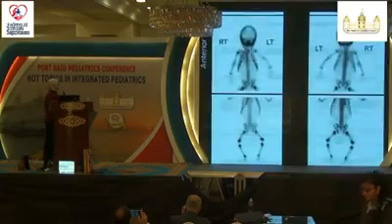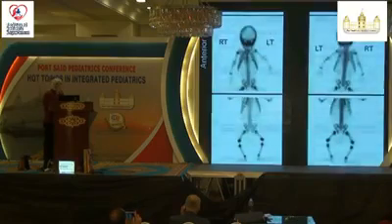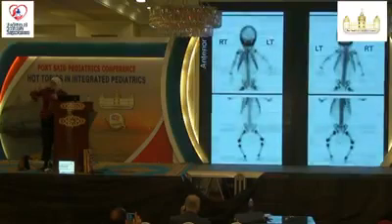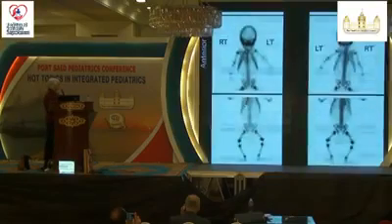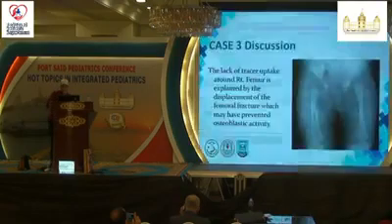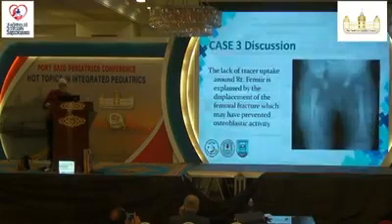Yes. Okay. Here are the hotspots, posterior right ribs, indicative of other fractures, which was also what we call the compression fracture. When a child is abused, the abuser grabs the baby, squeezes and presses hard on the ribs. Now look at the right femur. Where is the spiral fracture that we already saw in the X-ray? Why can we not see uptake? The lack of tracer uptake around the right femur is explained by the displacement of the femoral fracture, which may have prevented osteoblastic activity.